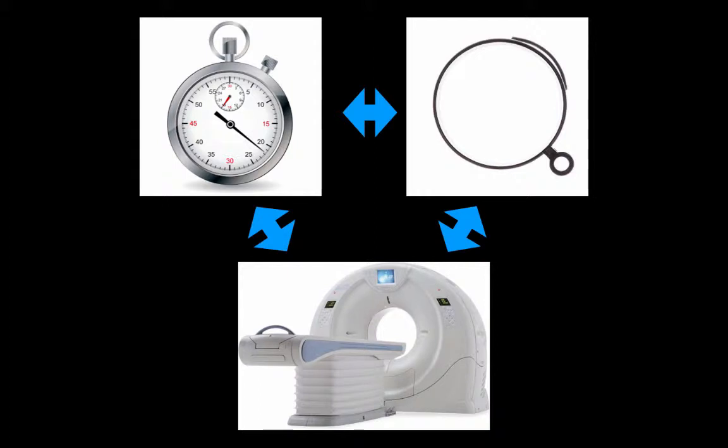Once again, these are time-sensitive conditions, and we need to get them what they need quickly. My plea to you, my personal practice, is just to take a second or a few seconds and look at that AAA. We're going to talk about some characteristics of rupture. The idea being, if we can communicate to the vascular surgeon that the aneurysm is definitely ruptured based off of our ultrasound, that's going to potentially mobilize things quicker.